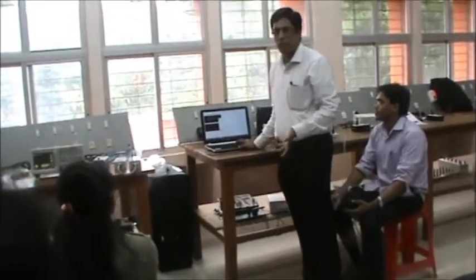Sampling it at 1 kilohertz or 2 kilohertz basically. So I am sampling it by default here. I recorded for about 10 seconds. Now this data, let us try to retrieve it in digital values. So from online mode we go to offline mode and then retrieve the saved data.